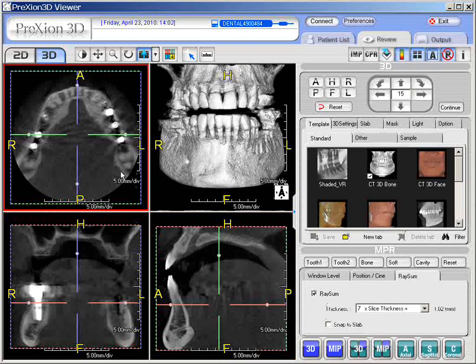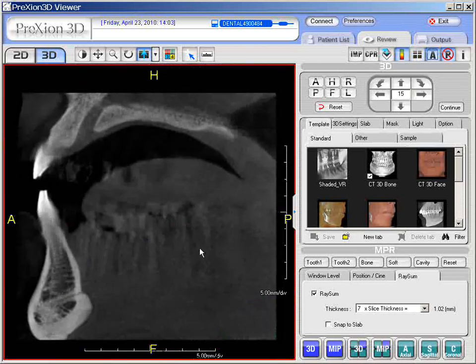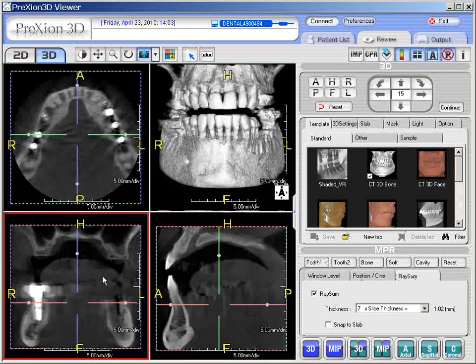Again, this isn't even the grainiest image you'll ever see. You'll have patients of various different image quality come across. One patient may look beautiful, the next comes across as quite grainy. That's pretty common with the CT scan. So just realize that you can circumvent that somewhat by applying the Raysum feature or window leveling to help increase the smoothness of the image.